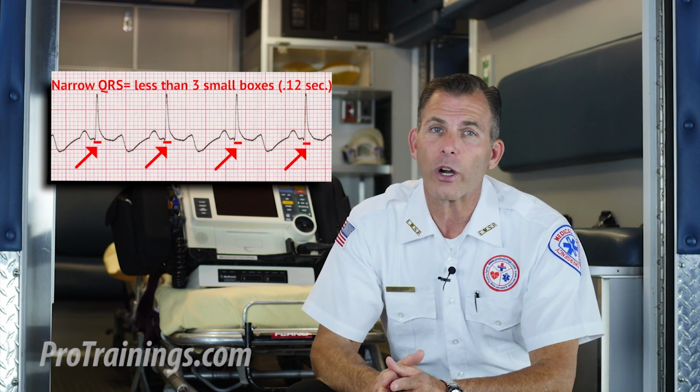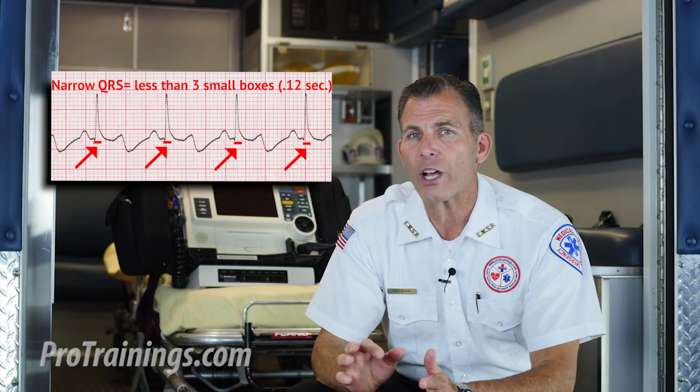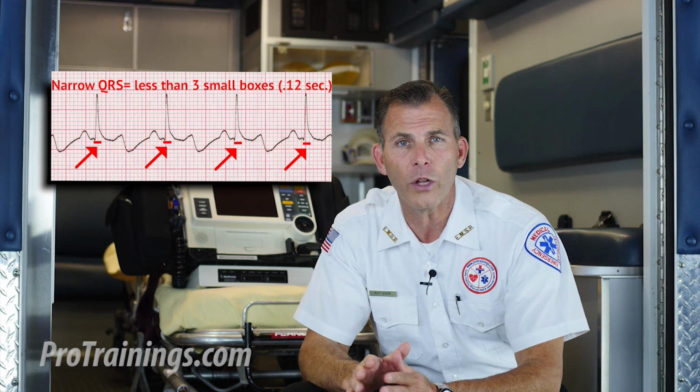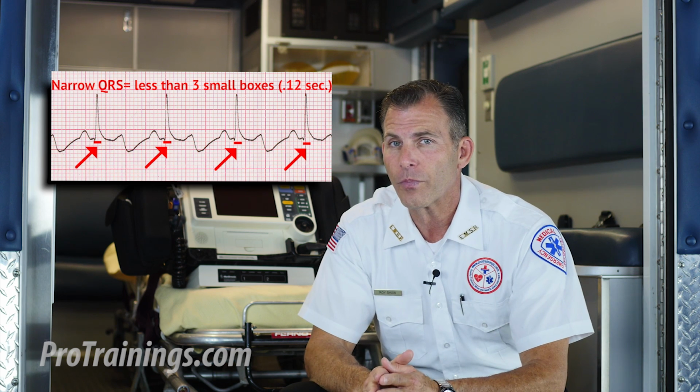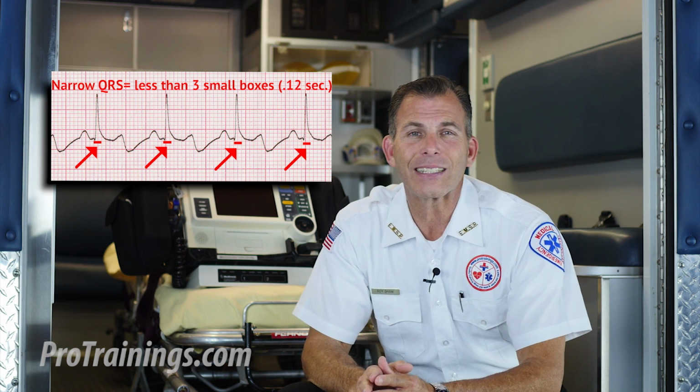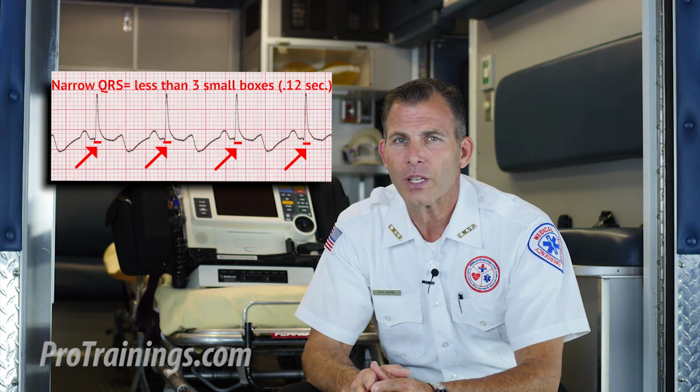Then we look at the QRS complex. Is the QRS interval less than 0.12 seconds? Is the QRS wide or narrow? Are the QRS complexes similar in appearance? You see, in using a systematic approach to interpreting the ECG rhythms, we'll help ourselves and other ACLS teammates to efficiently, appropriately, and effectively diagnose underlying cardiac conditions.